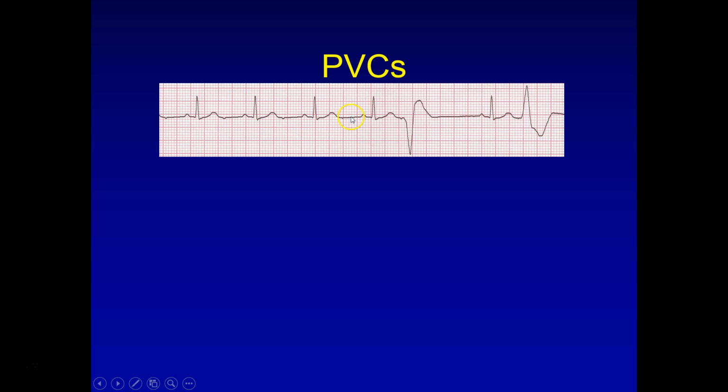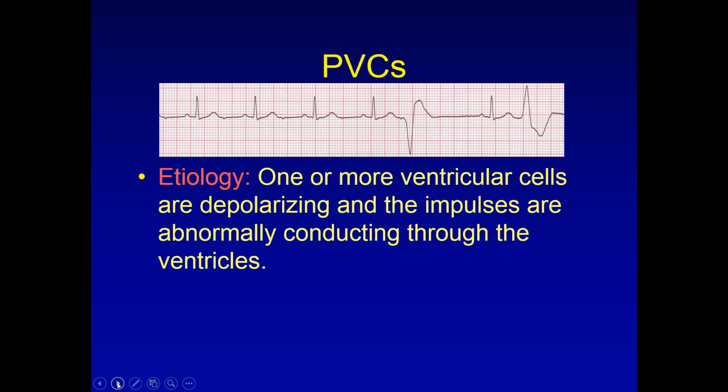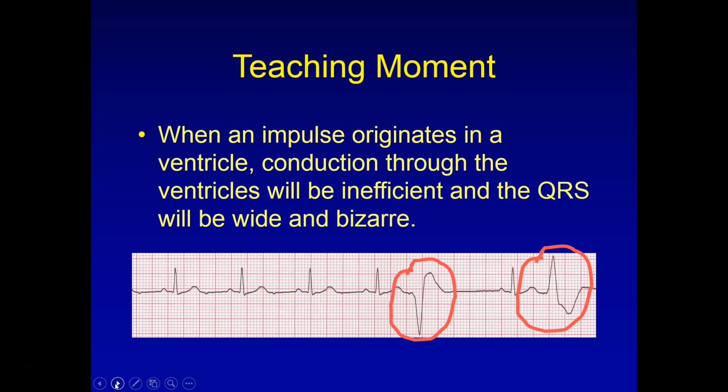Okay, and as I go along this EKG strip, and I have this premature ventricular contraction, this wave is upside down. And so what that tells me is that at this point right here, when that focus in the ventricle fired, it did so retrograde. It went back the other way because this is below the isoelectric line, and that does not follow the definition of normal conduction. So if you ever wondered why waves flip, that's exactly what happens. We're going to have a visual depiction of that coming up, but that's just going over what I just explained.